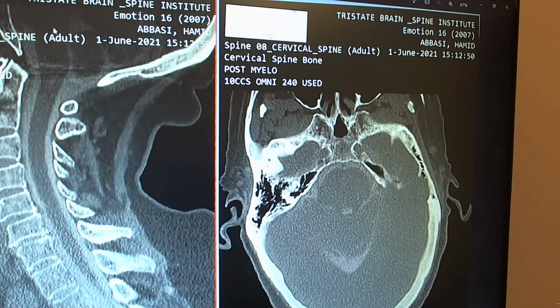What is this part of the brain called here? Yes, brainstem is below it. When you go a little higher up, the brainstem goes into a big bulb. What is that big bulb above the brainstem called? Pons. Very good. What does pons do? Why is pons so big? Who can tell us what is the function of the pons?